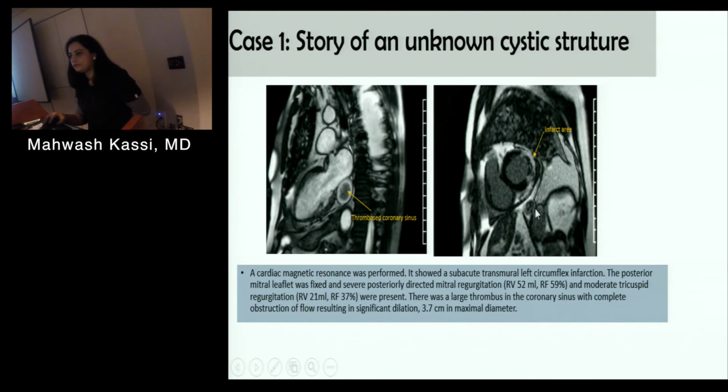Let me just ask the fellows, what's that black thing here? Right there. What's this whole thing here? Because remember, where should an infarct originate? Subendocardial, and work outward, right? So is this really an infarct, or is it something else?